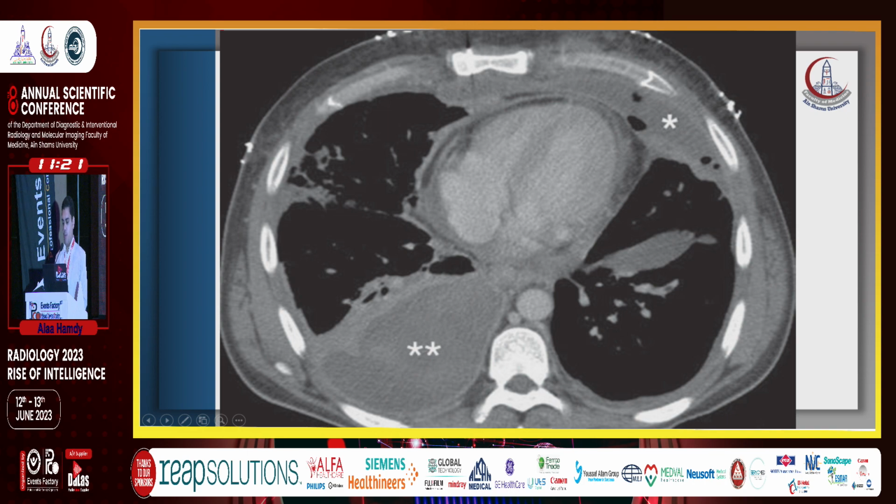This is a CT for a 49-year-old male who deteriorated clinically after 7 days. On the CT scan, we can see a focal fluid collection in the left anterior hemithorax containing gas, suggestive of empyema. We can also see a large focal collection in the right basal hemithorax with higher attenuation, and the diagnosis was confirmed as hematoma.